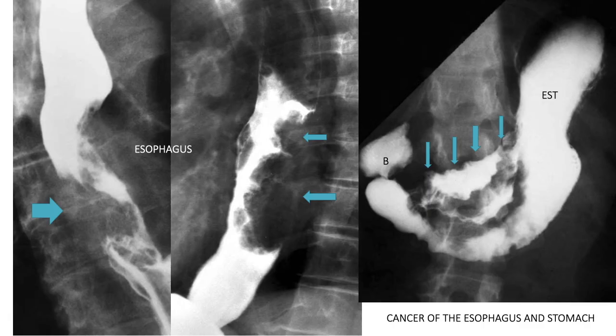So in this request, you can see this esophagus. Remember our first esophagus was complete. The one here has a filling defect. That means there is something inside of the esophagus which made the barium not cover the esophagus completely.